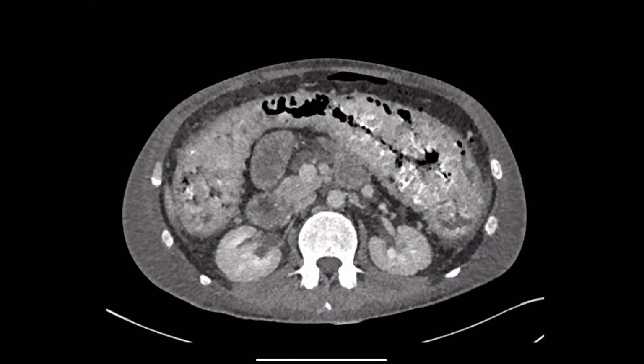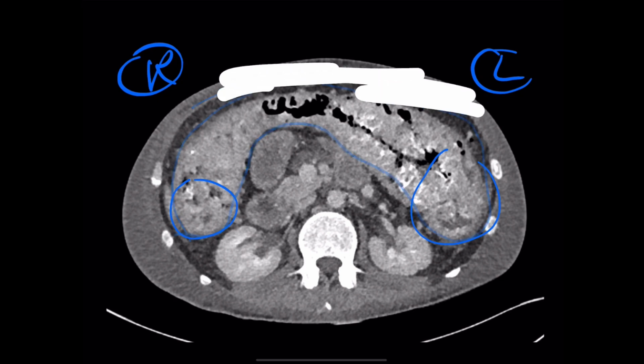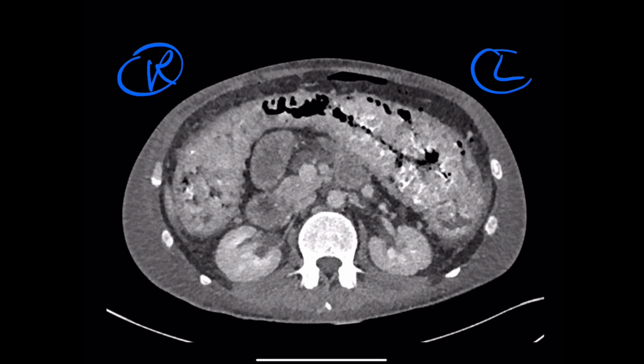Okay. But we have an axial image from the same patient, which again demonstrates the really gross abnormality. Remember, this is the left, this is the right. That's colon all here, large bowel. All large bowel. So we're getting a little bit of right colon, most of transverse colon, and then left colon here. So the one thing that we all worry about is this abnormality here.